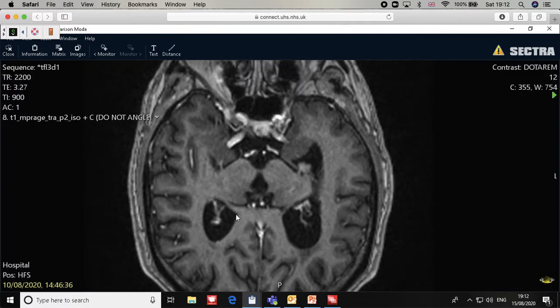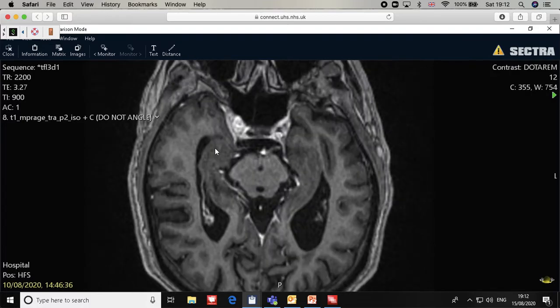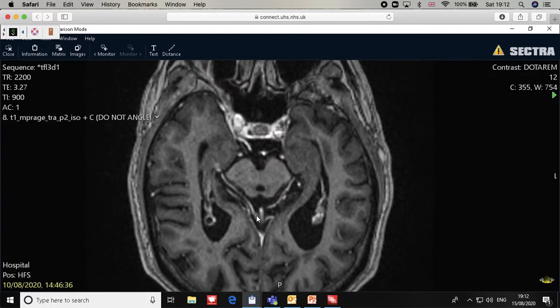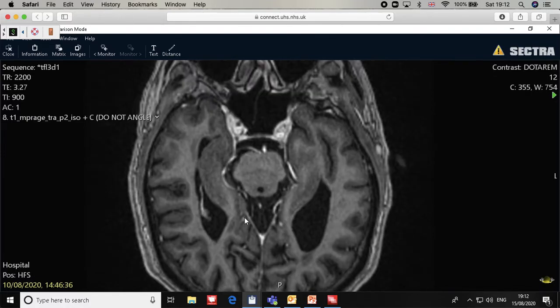Some people would do it the opposite way: go to the posterior horn and then track it. But I usually go to the temporal horn first, make the biggest part of it, and then the tail will go inside. Sorry for the connection. So you just end the tail without any problem there, and you don't have to take beyond that region.